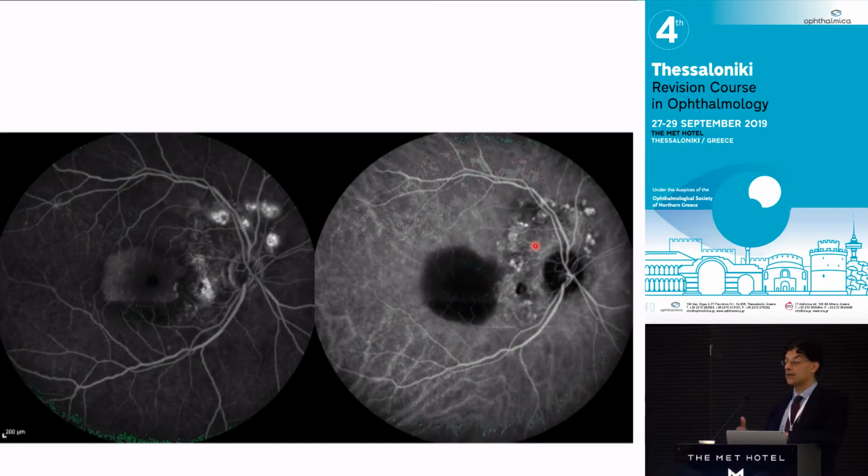There are now attempts at clinical criteria for this, but they're mainly based on Southeast Asian patients from the EVEREST trial, which is having a hyperfluorescent nodule on ICG plus an additional sign, which includes a dark surround, pulsatility on the video clip, which I think is virtually impossible to see, and a branching vascular network.